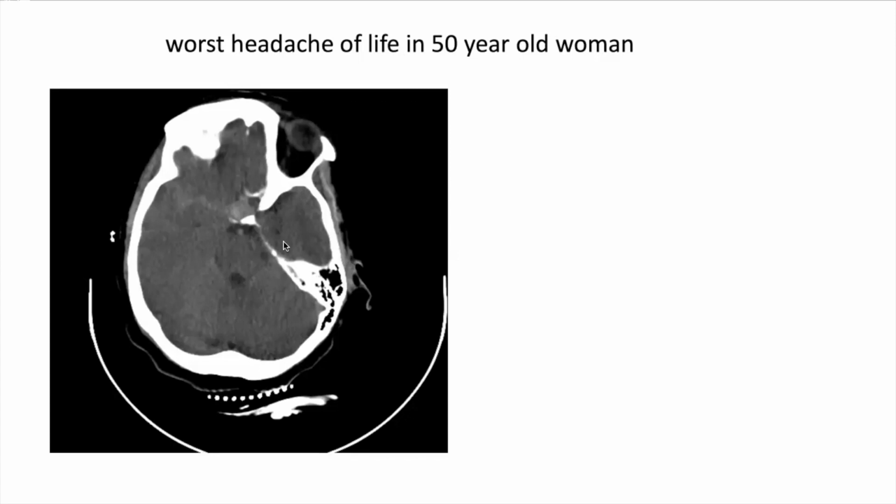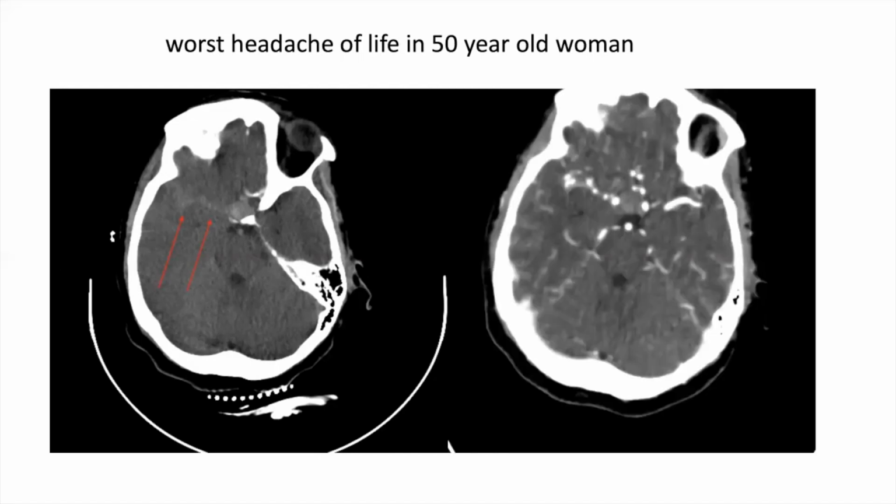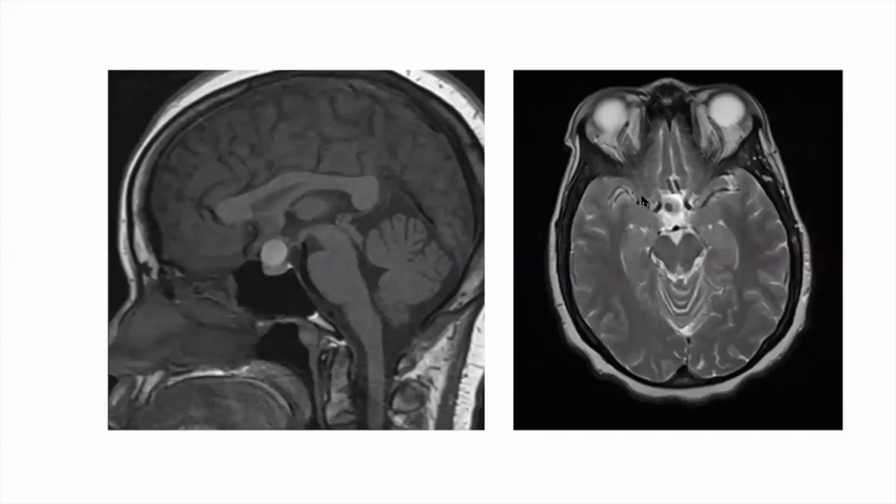Now, this was an unusual patient, but here we see there's a suprasellar mass with subarachnoid blood. And there were other slices here I'm not showing you, but the patient had presented with symptoms suggestive of subarachnoid hemorrhage. She went on to have a CTA that showed that it didn't have the typical appearance of an aneurysm, in that it should have enhanced at least comparable to the carotid artery in this frame. Patient went on and had an MR scan and had this appearance.